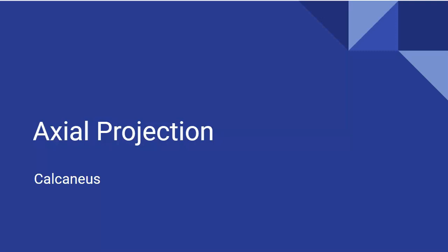Welcome to the image analysis for the calcaneus. We're going to review the common projections for the AP axial and lateral calcaneus. We're going to review image analysis guidelines, common positioning errors, how to identify them, and how to take corrective action.